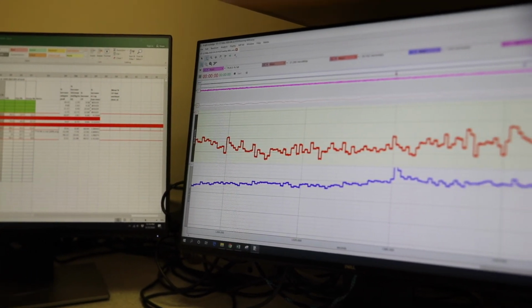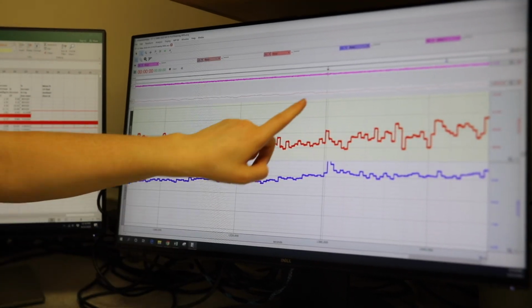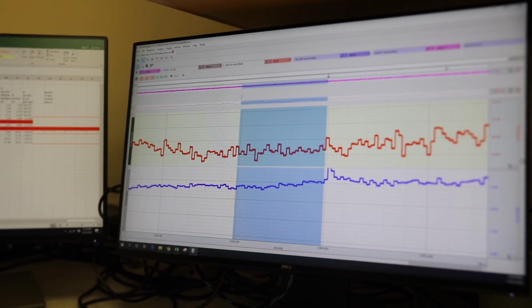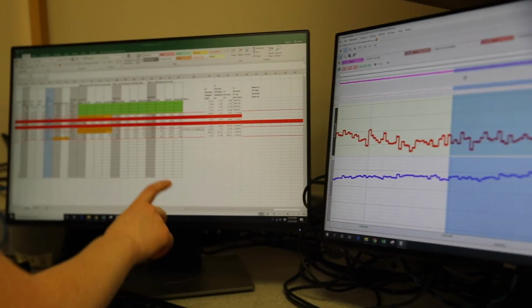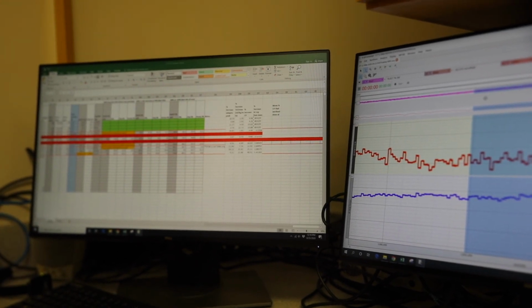Again, make sure that your cursor lines up perfectly with that triangle. Get the last 60 seconds. And then we're going to record again these 4 numbers into these 4 cells right there. And that's all of the NIRS data that we'll record.